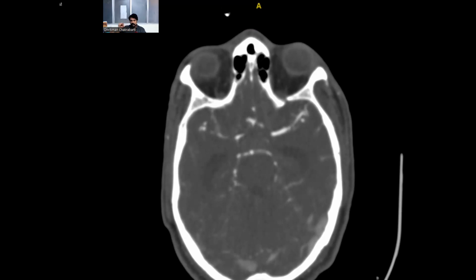towards the posterior part. After that, P3 is the posterior part, and that part extends until it starts breaking up into branches inside the sulci of the occipital cortex. And then when it breaks up into multiple branches, it is known as terminal branches or the P4 portion. So to recap, from your basilar bifurcation to the PCOM is P1.